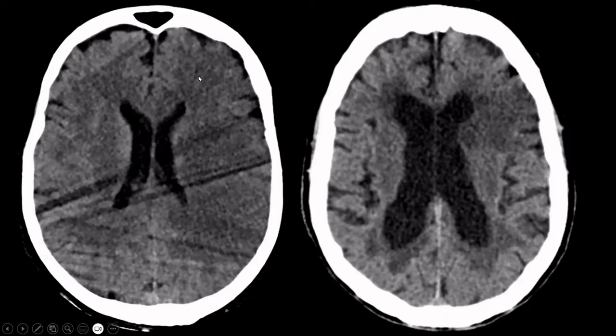This is a patient with a large left middle cerebral artery territory infarction, but at first glance, you really have to look carefully at these images. The midline seems okay, but there's an asymmetry between the lateral ventricles. Mind you, a slight asymmetry can occur in the general population, but it can also be a sign of a space-occupying lesion. In this case, it's not a tumor, it's not a hemorrhage, no, it's brain edema.